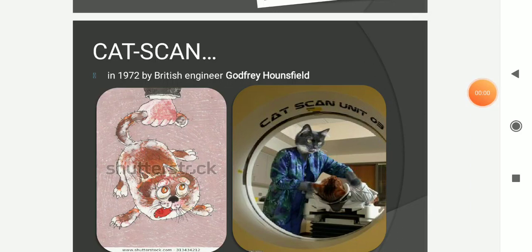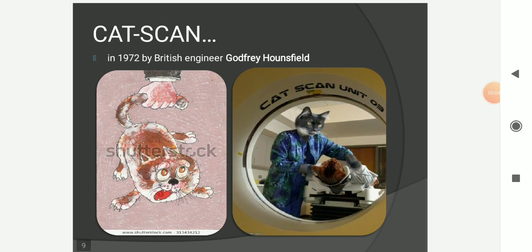Doctors, today we are going to discuss some radiological signs, and these signs will help you in making your principal diagnosis, and it will somewhat give you an idea about the concerned disease. So what does it mean?